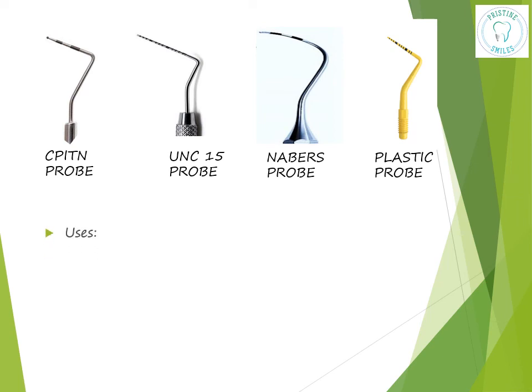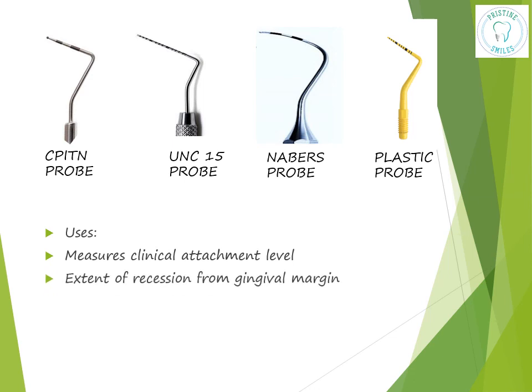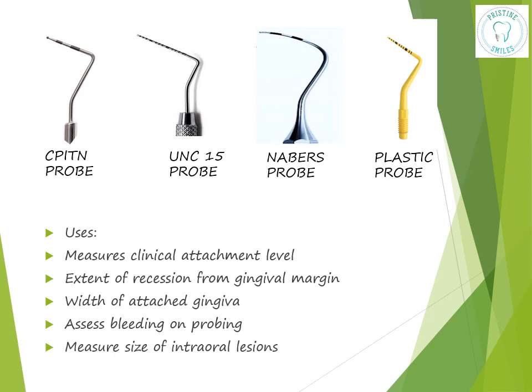Now these probes are used for measuring the clinical attachment level. We also check the probing depth, the extent of recession from gingival margin, width of attached gingiva, whether there is bleeding on probing. It is also used to measure the size of intraoral lesions and determine mucogingival relationships.